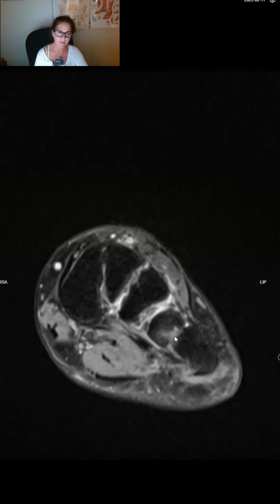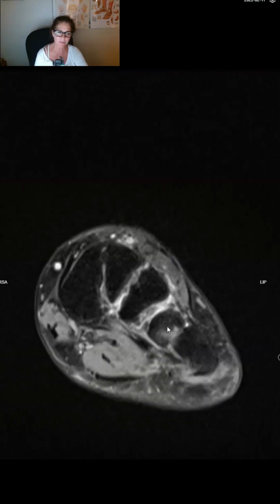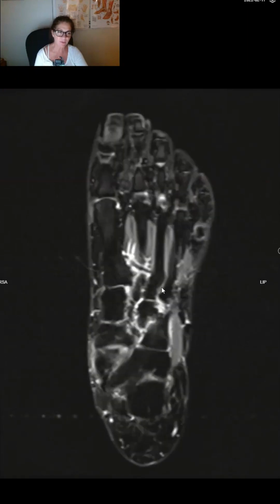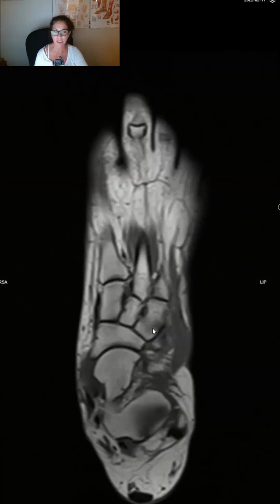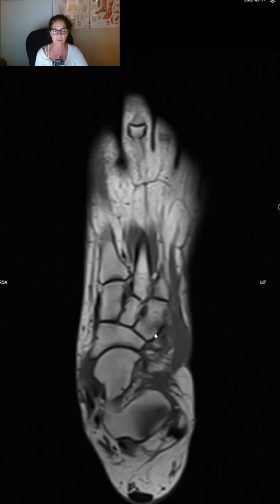And because of the proximity and the arrangement of these bones, we can see that there may even be some more stress response between the base of the third and the fourth, that there's a close proximity. But what I'm seeing is this stress response. So let's take a look at T1 weighted images, and notice I'm seeing some kind of T1 change. So this is not just a brand new contusion. This has had some time to form some degree of calcium response or sclerosis.